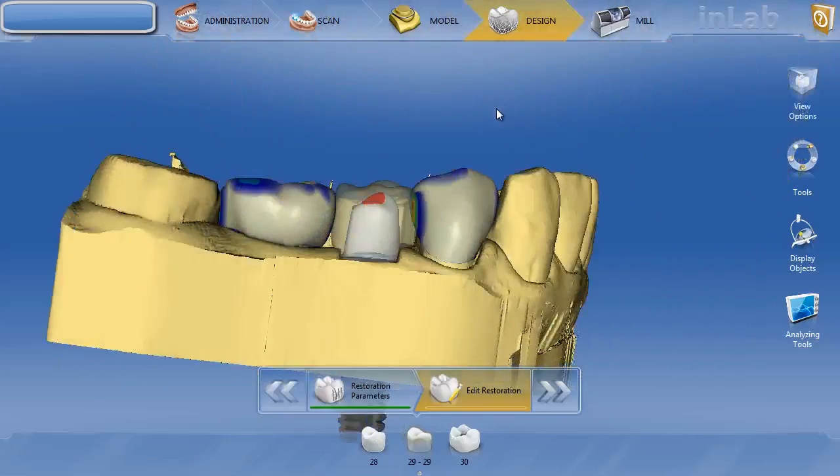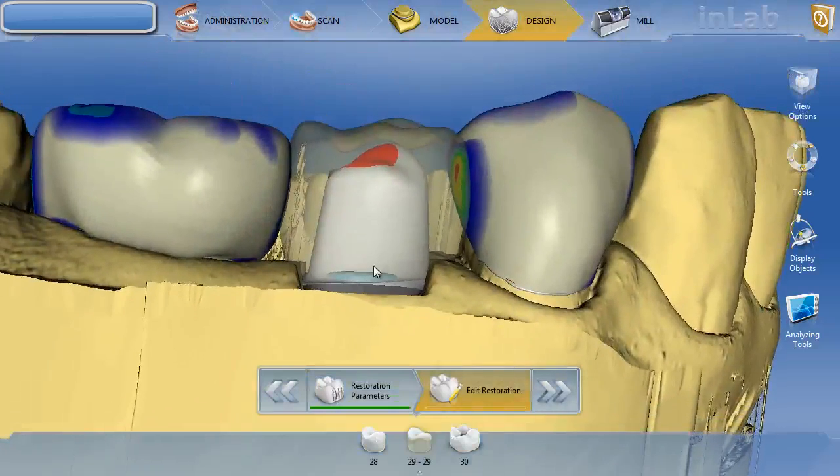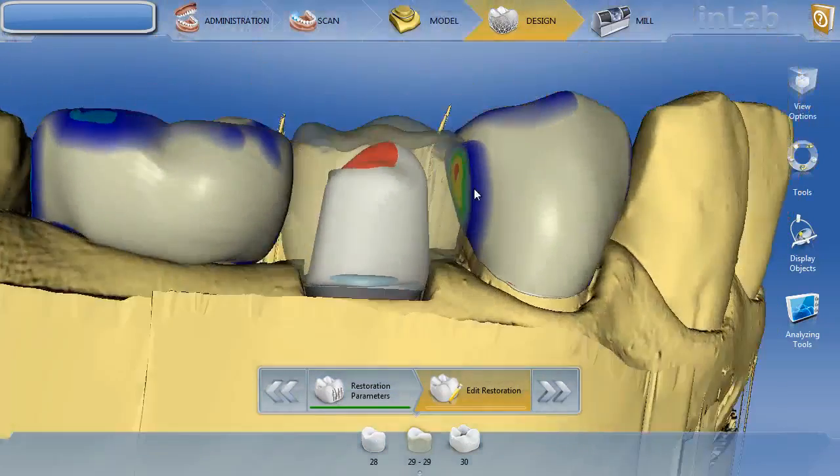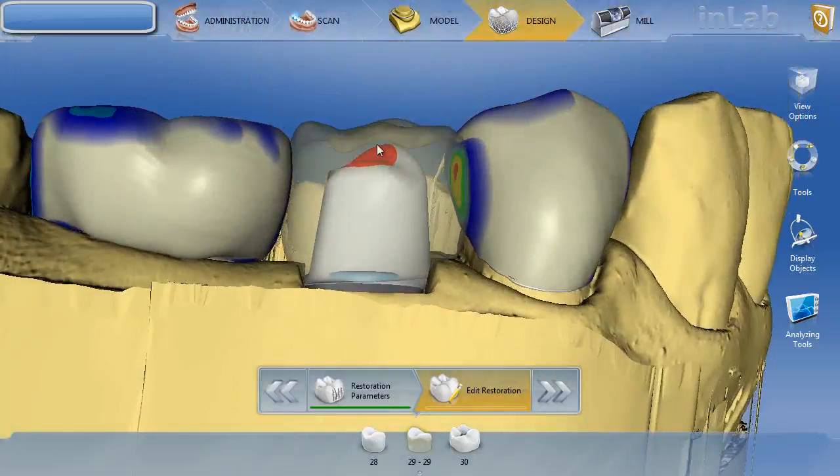It's not perfect by any means. We still have some minimal thickness showing through down here. We still have the titanium base showing through down here. And we probably actually don't have enough room for our Emax restoration here. Now this is actually one of the limitations of the titanium custom abutment software: when the titanium base is showing through. Generally if it's less than 5 millimeters or 5.5 millimeters from the base of the tie base to the occlusion, you're going to have these problems.